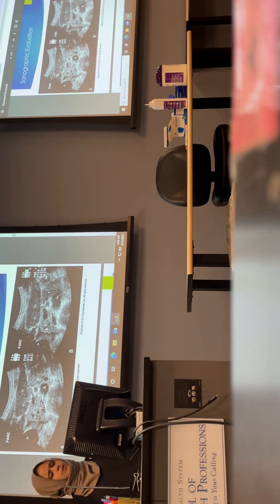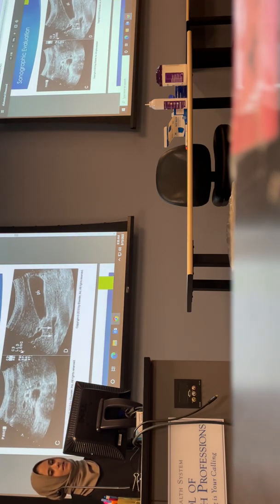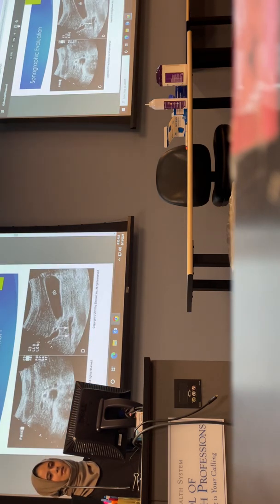So this is pointing to two structures. What is the one at the bottom? CBD. What is the one at the top? Gastroduodenal artery. I'm glad that I feel like the imaging assignments are just forcing you guys to review the images a lot more, so they're not shoved down your throat towards the end of the semester.